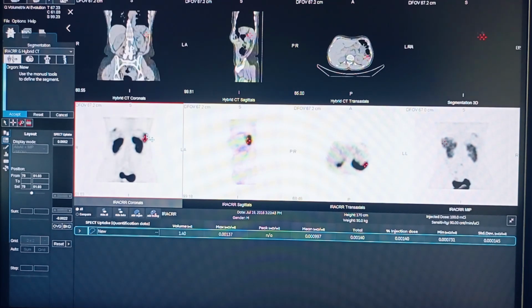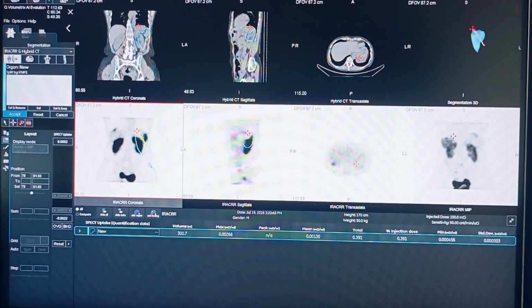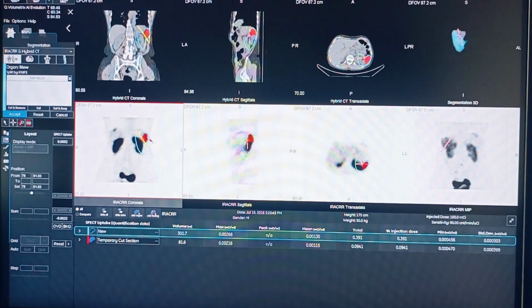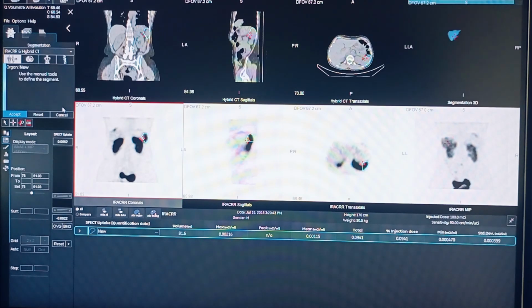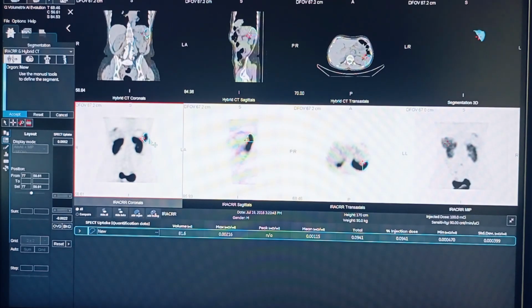Okay. So this is a good case. So here suppose kidney is selected. Now you want to separate it, right? So we have a knife here. Use the knife to cut it. Now this is shaded. And this is unshaded. So here you have options: the shaded area you want to cut or you want to keep. So we want to keep. Yes, cut and keep. So now it will grow for that only. Right. So this is the only area selected.